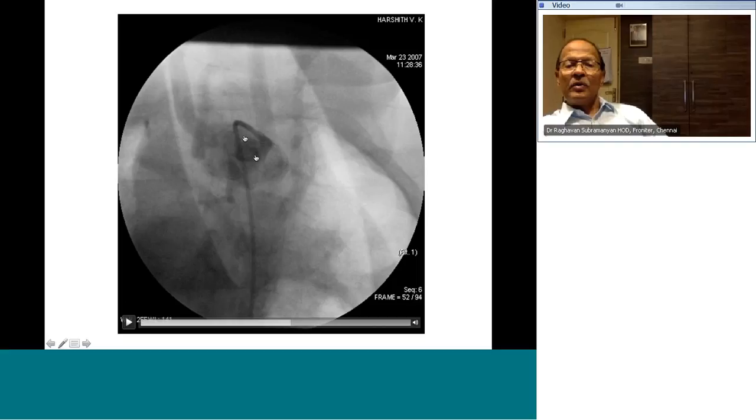The neck vessels, the arch and the aorta, it's not possible to comment on in this view. The only thing you can comment on is the three sinuses, 1, 2, and 3. You will be able to identify which coronary artery is coming out from which sinus. You are able to separate the left and the right coronary sinuses and the non-coronary sinus completely. Okay, this is the laid back view.